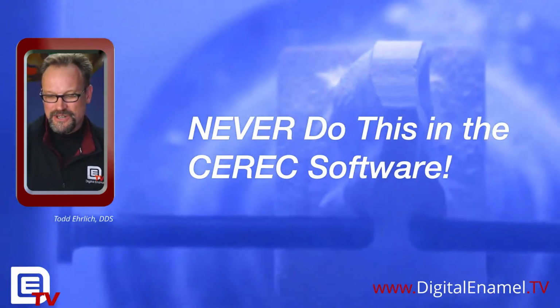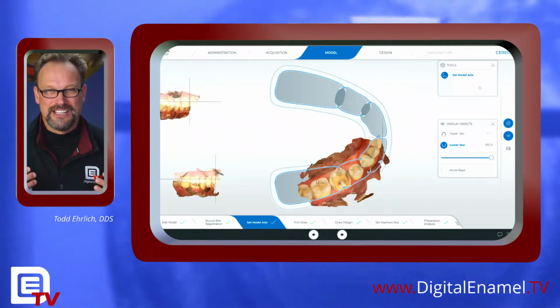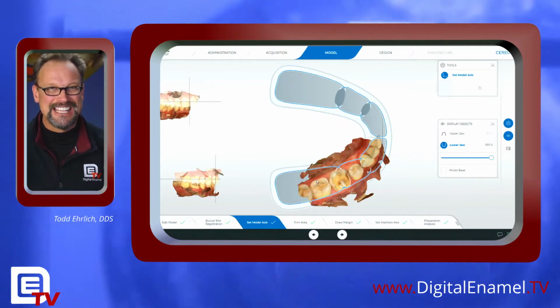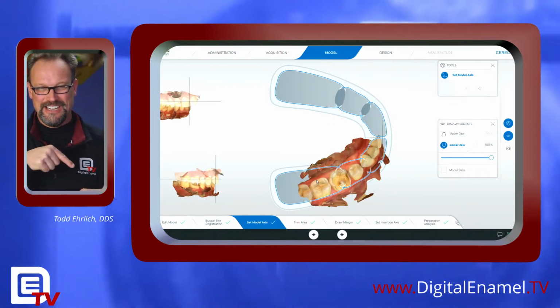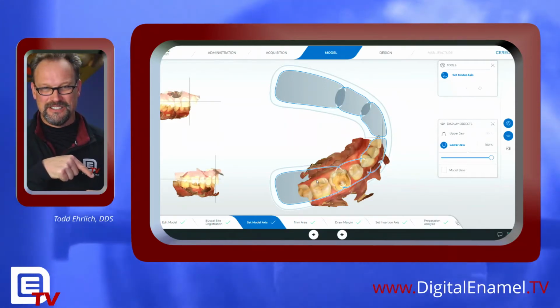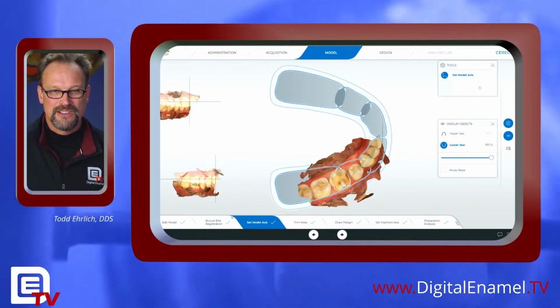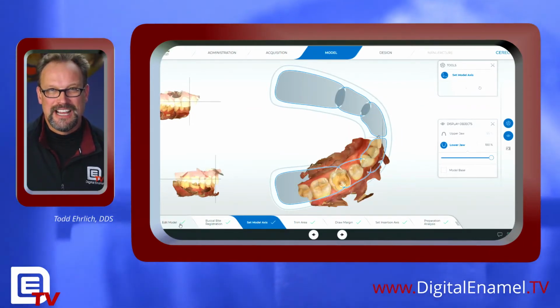And what I'm talking about is going to the position in the model phase where you can edit the model. So where it is right here. Let me get oriented. Right there, that last little bit where it says edit model. I'm going to click on that. So it's over here in this little location, edit model.